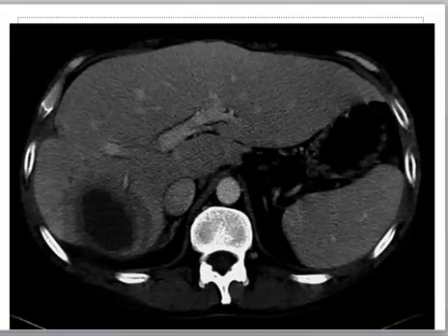Here you have the typical example of an abscess. An abscess is an area of liquefaction surrounded with edema around. This is a typical example of an abscess, but this type of abscess is usually amoebic, so long as it is single and large, while pyogenic abscesses are usually small and multiple near each other, multiple foci of lucencies near each other.